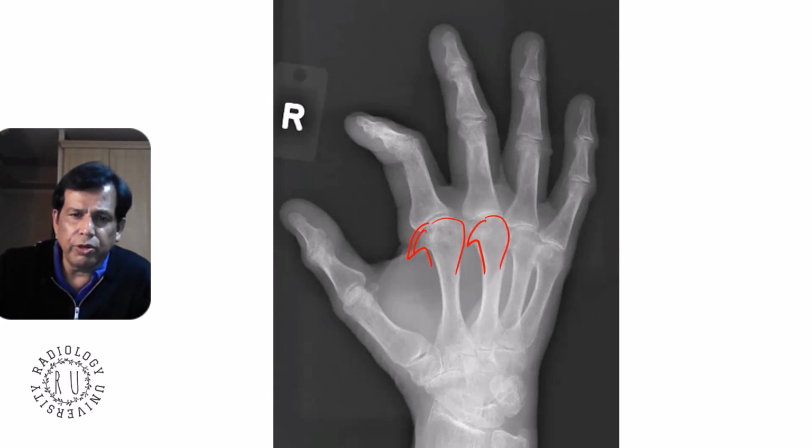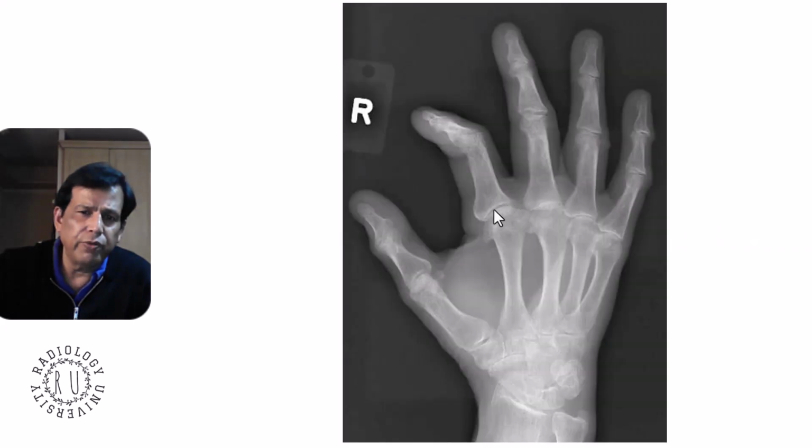There is some osteophyte here, and so what's going on? Okay, there's loss of joint space, some osteophyte here. Looks to me like this could be an osteoarthritis due to some condition or not. But why are you getting a hook on one side here? I don't see anything obviously like an articular destruction, but hooking.